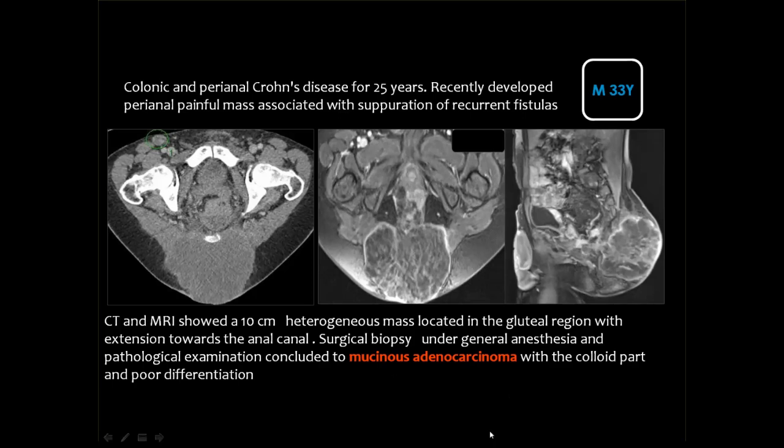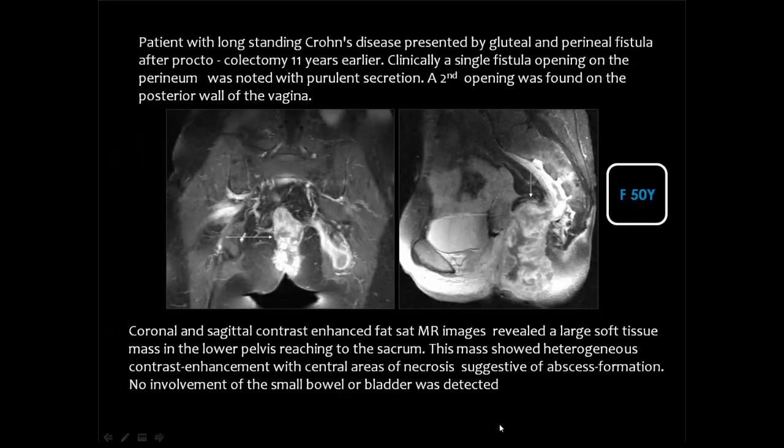And this is another example of a patient with long-standing Crohn's disease. She has got a mass along the course of the fistula, maybe previously, and the mass is heterogeneously enhanced, and it proved to be malignant.